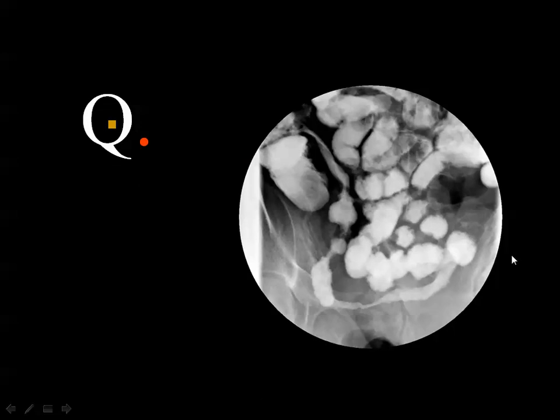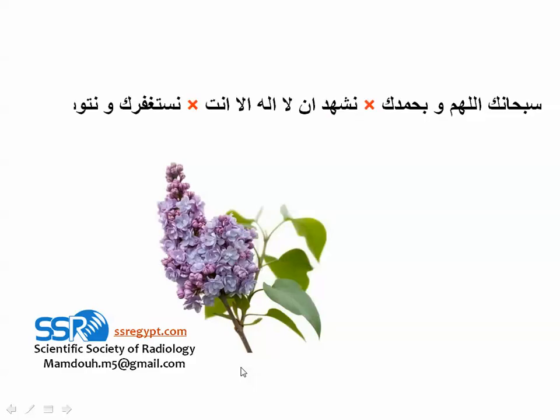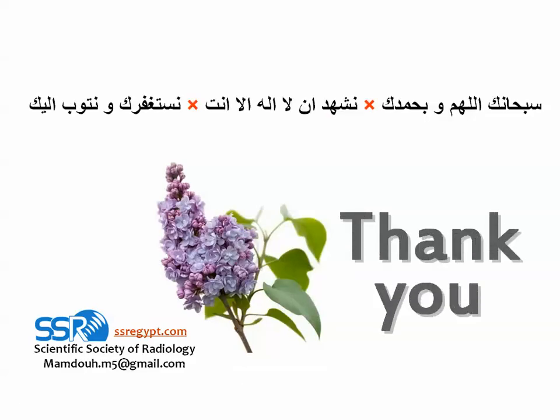Crohn's disease. Spot film on the terminal ileum from a barium meal follow-through study showing irregular luminal narrowing of the terminal ileum with areas of stricture, diagnostic of Crohn's disease of the small bowel.